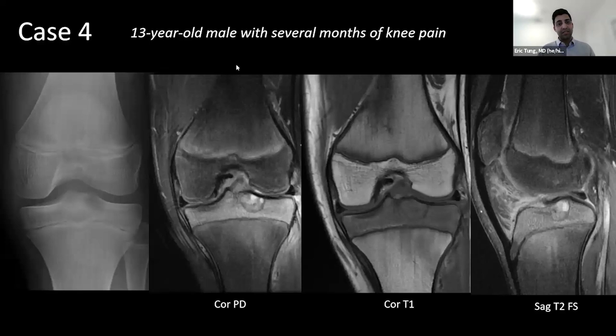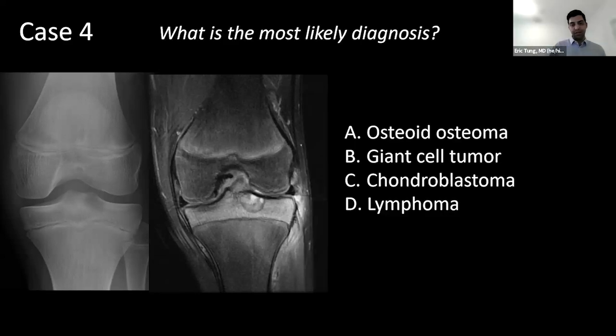Let's take a look at this case. This is case 4, a 13-year-old male with several months of knee pain. What's the most likely diagnosis for this lesion?